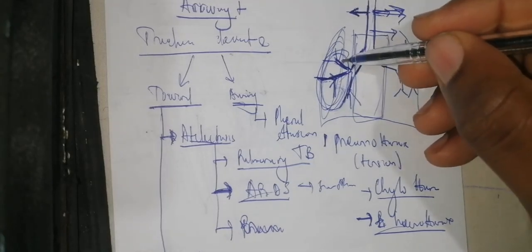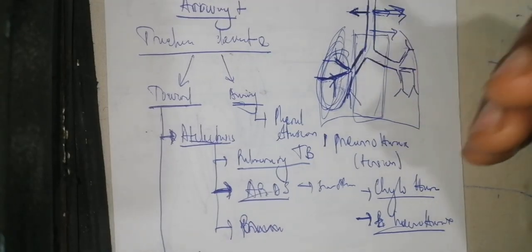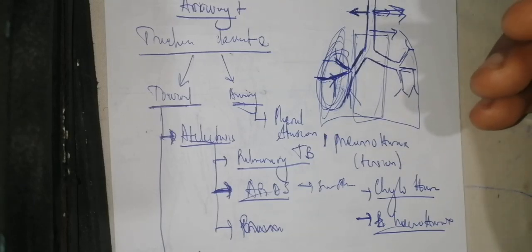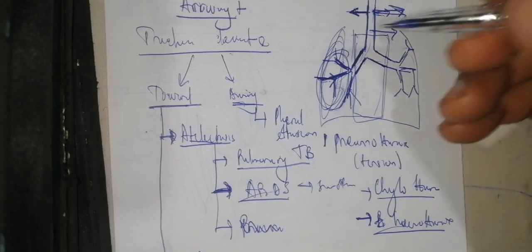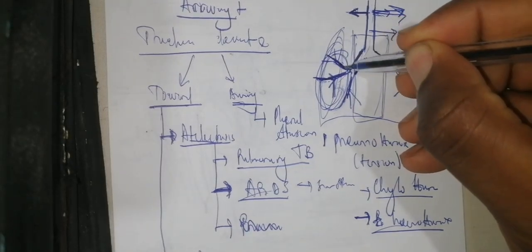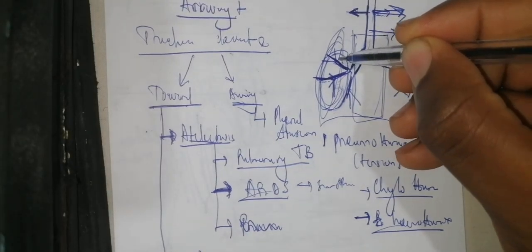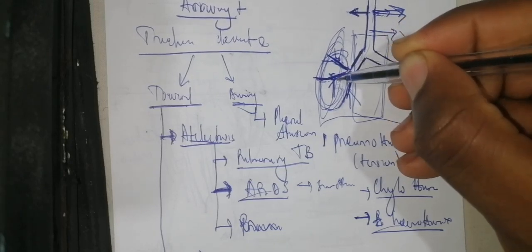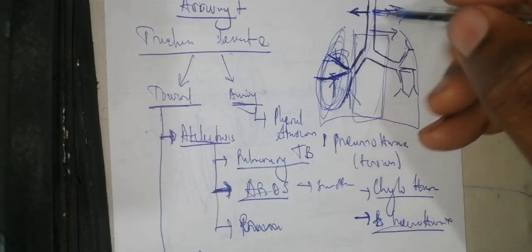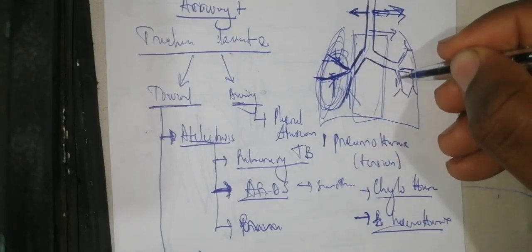Now, the next thing is that you can see also peribronchial opacities. So if you see lines here like that, what you need to know is that there can be opacity just close to the bronchi, so to the bronchioles.